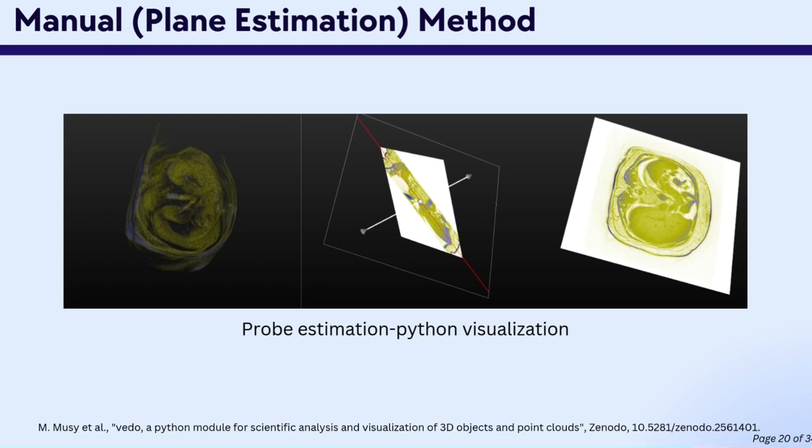We proposed an alternative approach using manual registration instead of the iterative automatic method. For this, we utilized the Vedo Python library, which provides tools to visualize and interact with 3D CT images. By inputting the 3D CT NIfTI image, the library generates an interface like the one shown here, allowing users to manually adjust and align the images with precision.